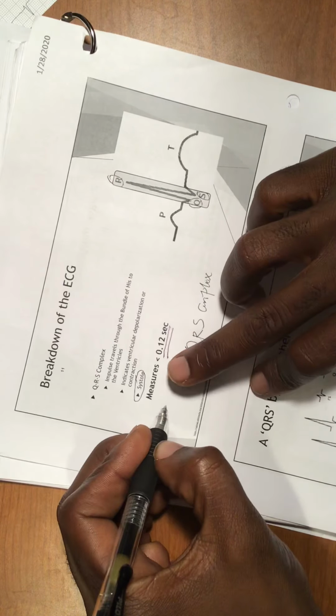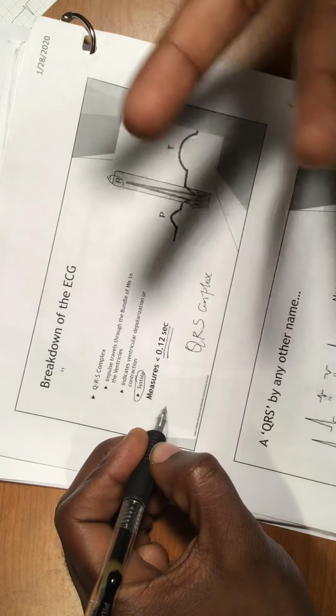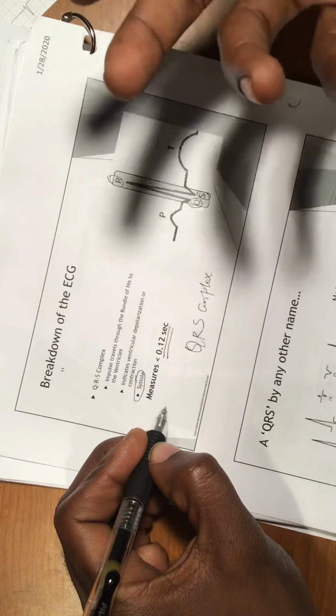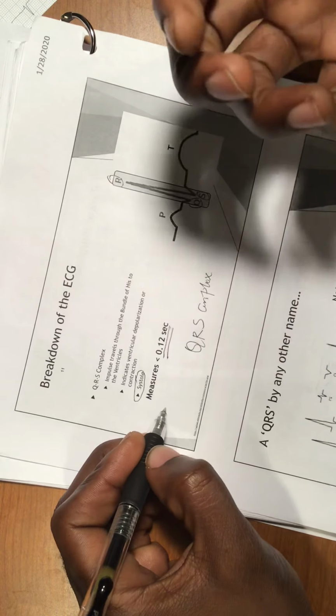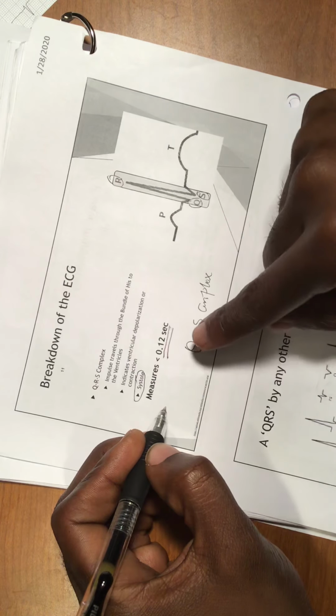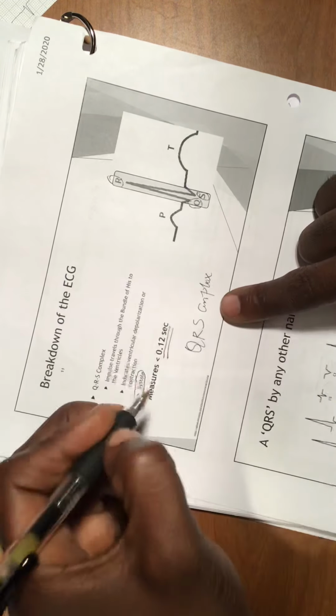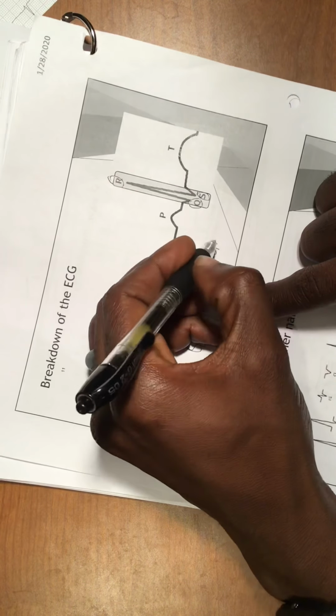For example, sometimes you might have a left bundle branch block or a right bundle branch block, or sometimes you can have a really slow ventricular contraction, which can mean you have left ventricular hypertrophy. So you can have a QRS complex that is larger than it's supposed to be. So remember, guys, that the range for the QRS complex is less than 0.12 seconds. This is so important. I just noted it down here, you can see it with me. I put it right here so you can see it. I just want you guys to know about this.